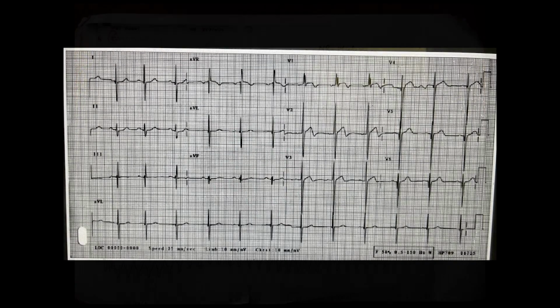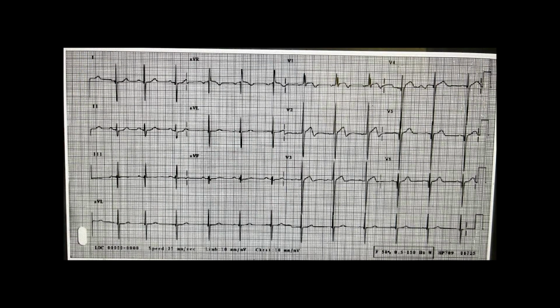Thank you. Determination of QRS axis in image 7. Observe all 6 frontal leads, pause and calculate the axis. If you see, all 6 frontal leads show equiphasic deflection, meaning equal positive as well as negative deflection. So the QRS axis cannot be determined in this ECG. This is called an indeterminate QRS axis.